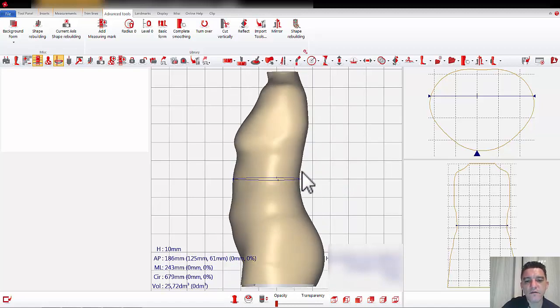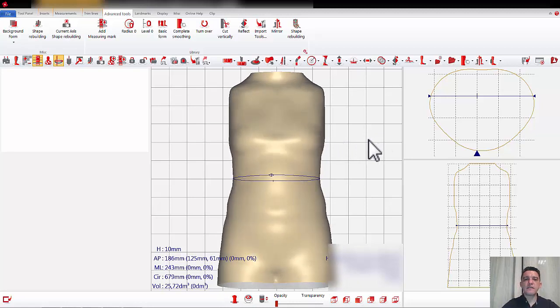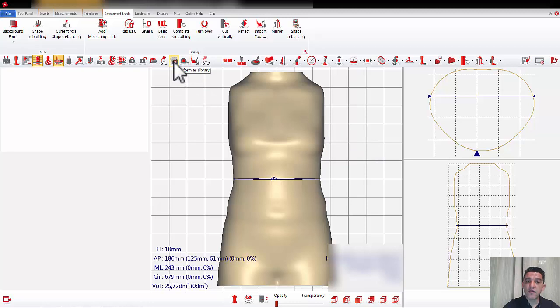In a real case, of course, it would be great to leave, for example, this part better. Probably I could do the same, but anyway, this is the process, okay? And after this, you decide which rectification you want to apply, and after that save it like a new RXP, like before.